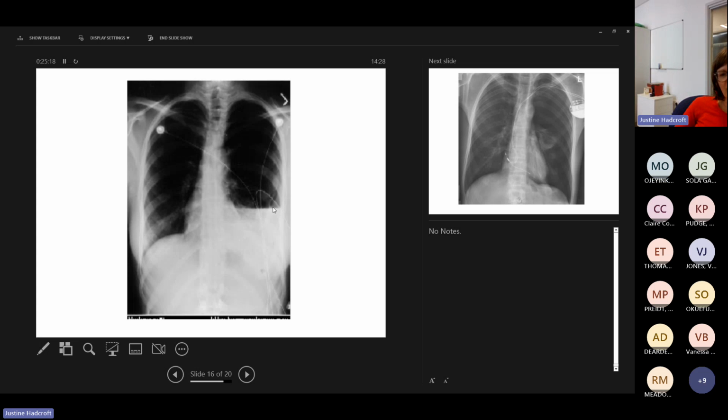So this dead straight line that's very dense underneath, this is a left-sided hydropneumothorax. And that could be caused by trauma, it could be iatrogenic after a procedure, it could be spontaneous, but that person would perhaps need an ultrasound and maybe a chest drain.